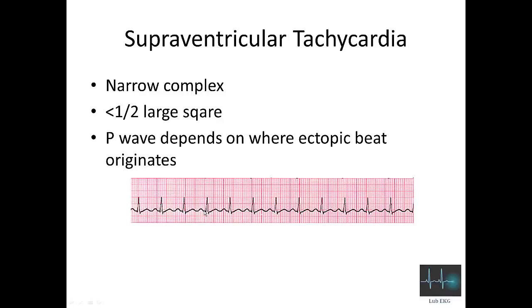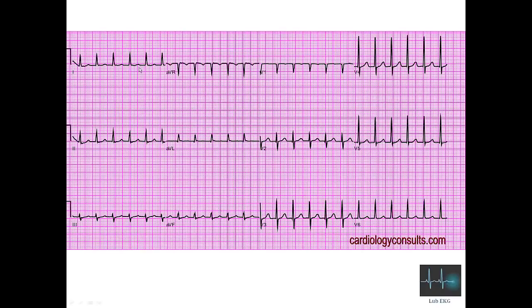Just think how the signal travels towards an electrode. In the other one, we can most definitely say that the signal is somewhere closer to the AV node because we don't have P waves. So we're not able to read any activity in the atria.